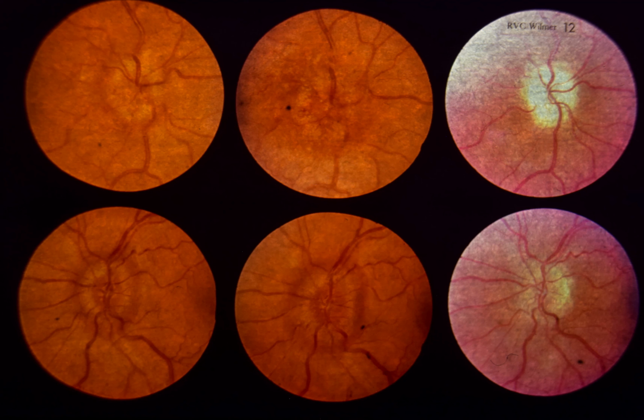After 6 months of steroid therapy, papilledema has become more severe. The optic disc capillaries are markedly dilated, and the larger retinal vessels are partially obscured by edematous disc tissue. Loss of visual acuity, worsening of papilledema, and the occurrence of transient obscurations of vision prompted subtemporal decompression. Upper right and lower right.